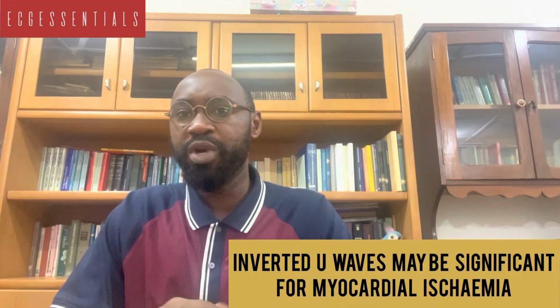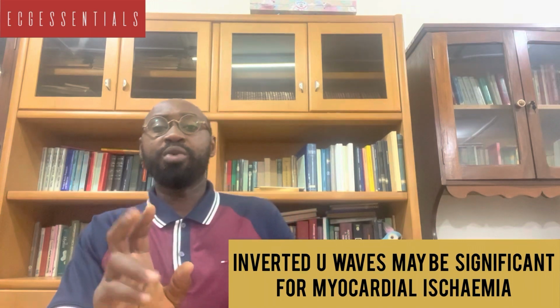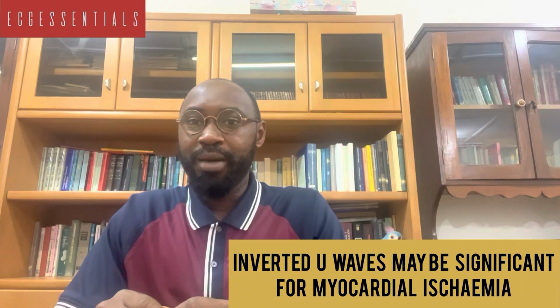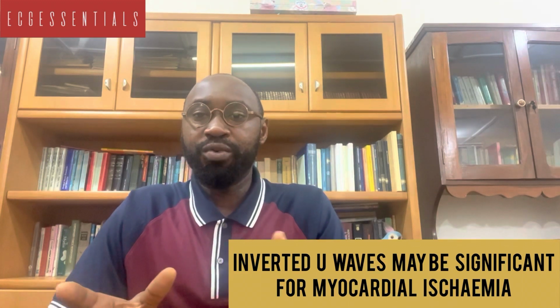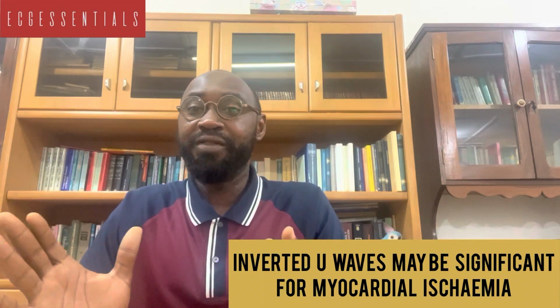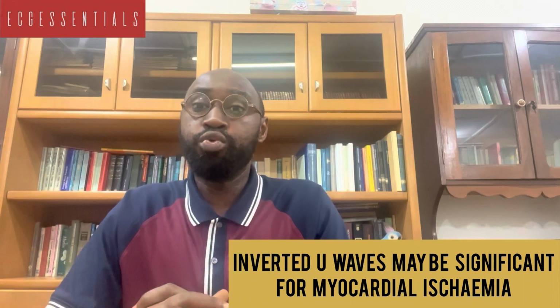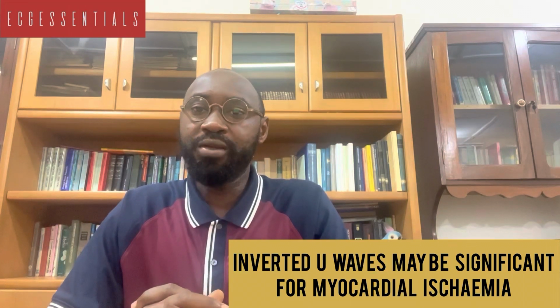But importantly, if we have a patient presenting with chest pain and the ECG shows inverted U waves, it is usually a very specific sign for myocardial ischemia. So it is not always that our interest should be in whether there's ST elevation or ST depression, T wave inversions. Inverted U waves, negative U waves in the context of an acute chest pain should also raise eyebrows so that we don't miss myocardial infarction.